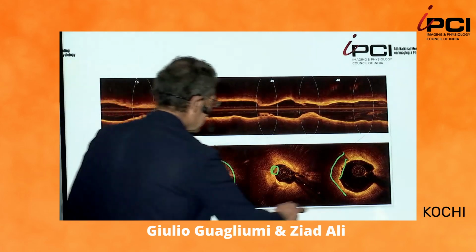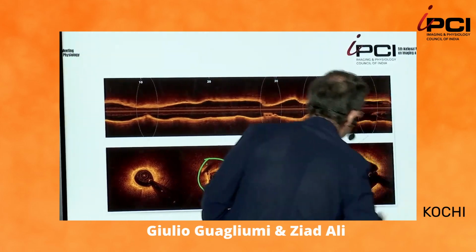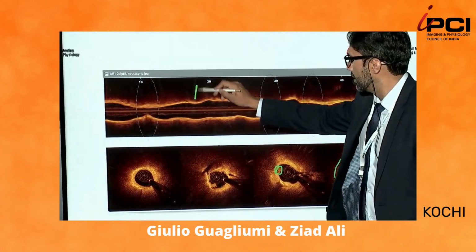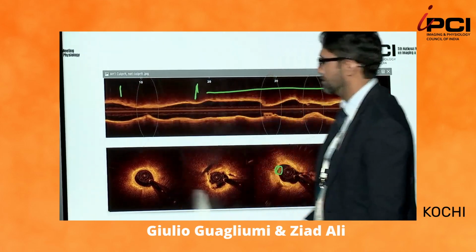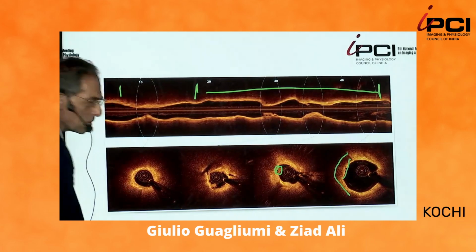Thank you very much. So, a question on this frame. Let's stay here for just a second. So the lesion ends here. Do we put a DES here, or do we cover this lesion? But this is intermediate. So thin? I'm not sure that is so thin.